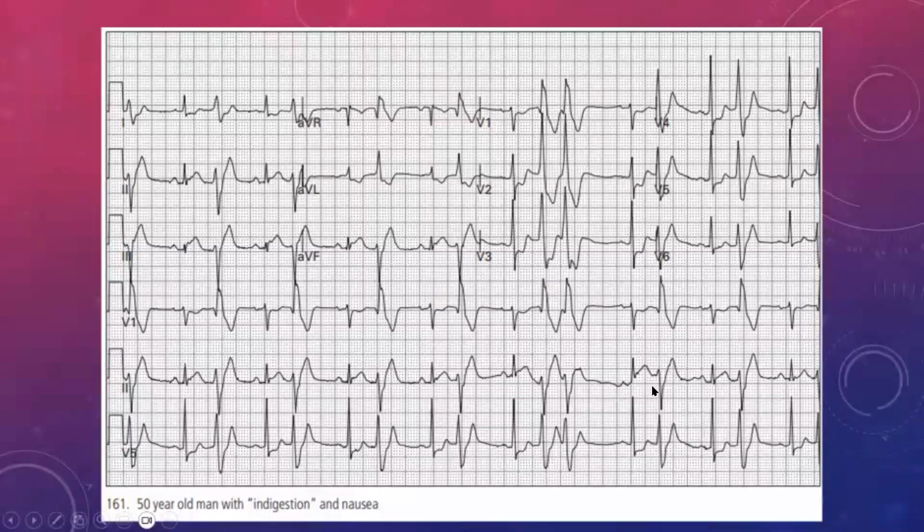So not the atrial rate, which is 50. The atrium is only beating 50 times per minute. But if you look at the ventricles, they're going at about 1, 2, 3, at about 100 beats per minute, sometimes 150. And there we go again. Here it comes closer to 70. Here it comes again closer to 150. So even though it's relatively irregular, what the heart is doing is that when it realizes that there's a volume problem and a blood pressure problem, or let's just say it actually has more to do with Starling's law, but I don't want to get too intricate with it now. So what happens is that the heart then is trying to rescue itself, okay, and prevent further infarction.